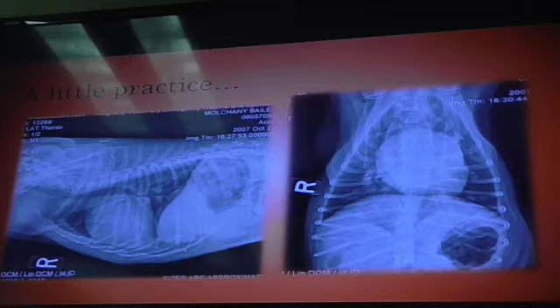Oh yeah, that one is going to be a little tricky, right? Remember what's the best way to take a thoracic image? On inspiration. Wonderful. A full inspiration, right? Because you want those lungs as aerated as possible to give you that context that you need to see in there and give everything that space it needs. Good job. See, y'all know more than y'all want to let yourself know.